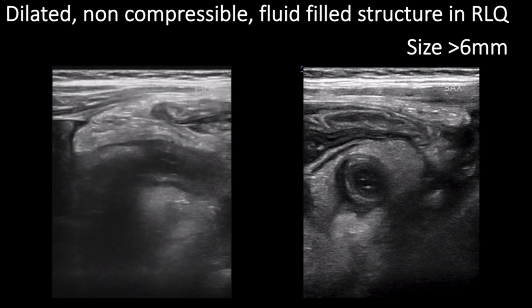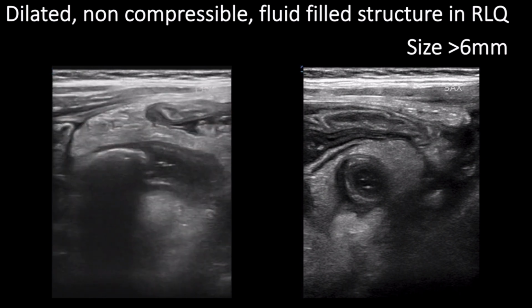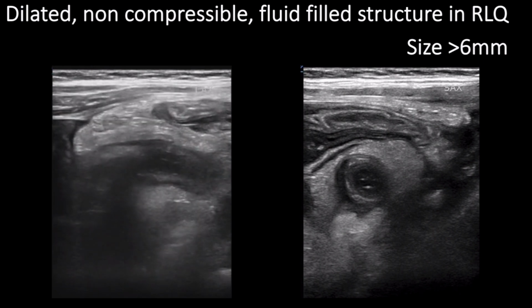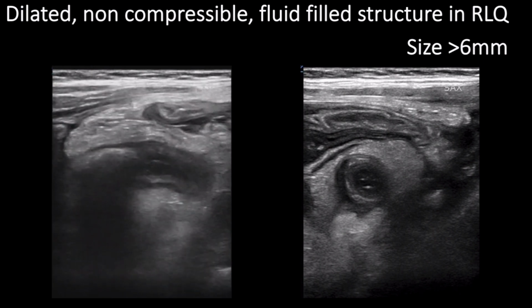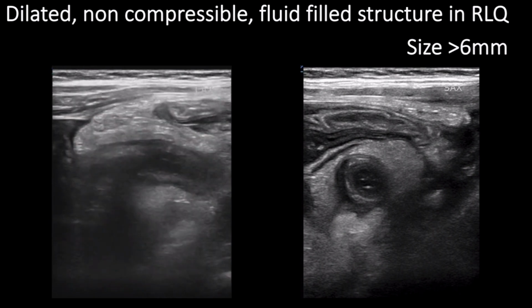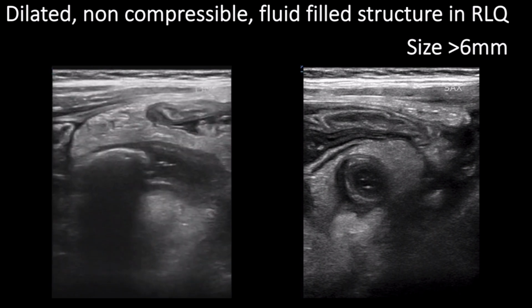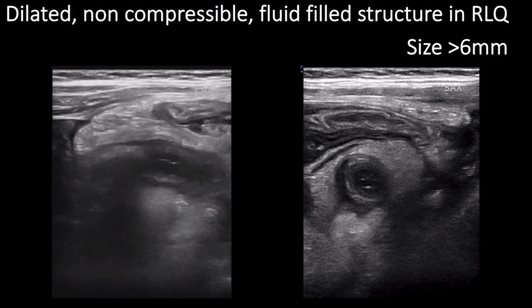Diagnosis of appendicitis in ultrasound is based upon the clinical presentation along with well-described sonographic findings. By far the most important slide of ultrasound findings is represented in this long and short axis view of the patient's appendix. This slide represents nearly everything you need to look for while performing an ultrasound to evaluate for appendicitis. When scanning for appendicitis, you're looking for a dilated, non-compressible, fluid-filled structure. This structure should be blind ending with a diameter of greater than 6 millimeters.